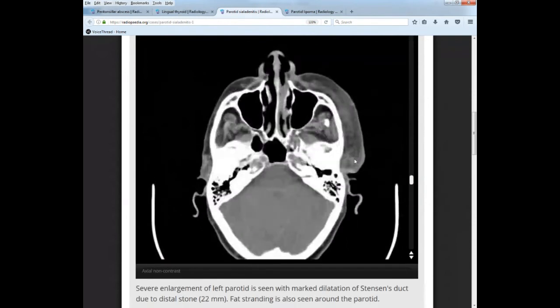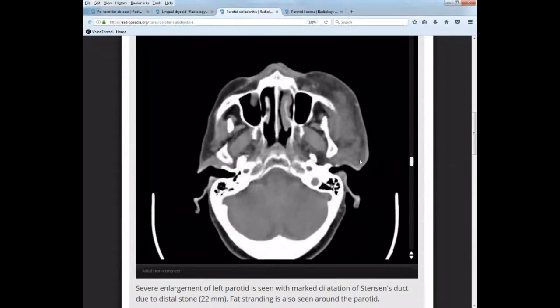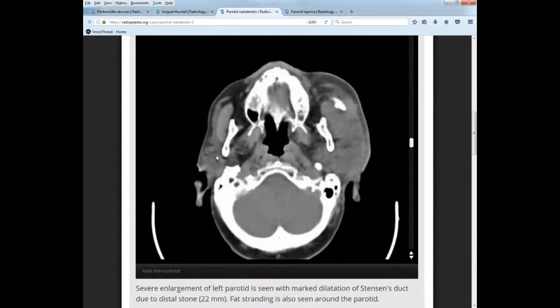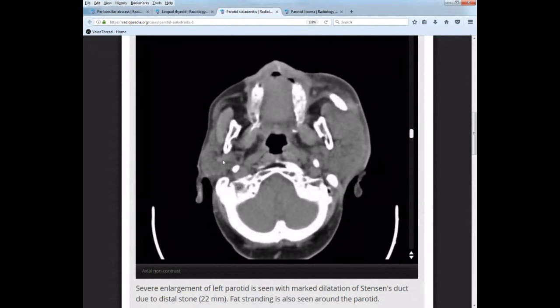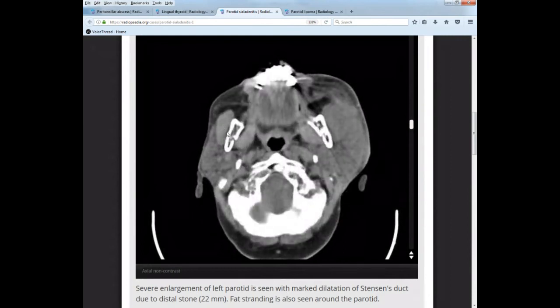The parotid gland, if you look over here on the side of the head, you can see on a normal, here's the normal one, just posterior to the mandibular rami, you have this like grainy glandular tissue over here. This is your parotid. Now see how it looks muscular? It almost looks, this is the, what is this, the masseter muscle over here. You don't need to know that. This is, it looks different. It looks kind of grainy or mushy, I guess, lobular maybe, compared to muscle, which is right next to it. However, this is the parotid gland.